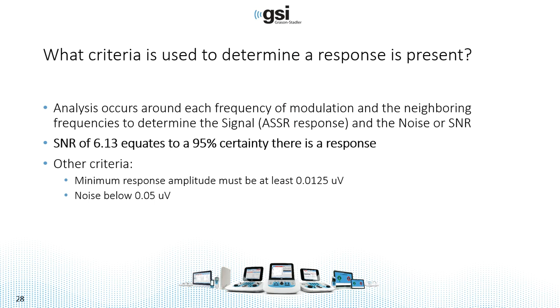There are a couple other criteria, such as a minimum response amplitude. So we want to make sure the response is large enough and not just some background noise. And we also want to make sure that the noise level is below a certain level, in this case 0.05.